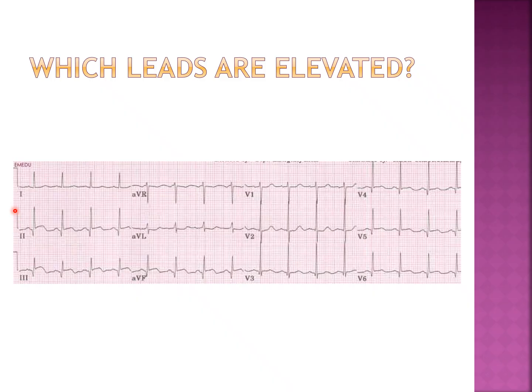And notice where it is. It's in my boot. So I'm going to boot this person out. This person needs intervention because they're having an inferior wall MI. So, did you guess inferior?